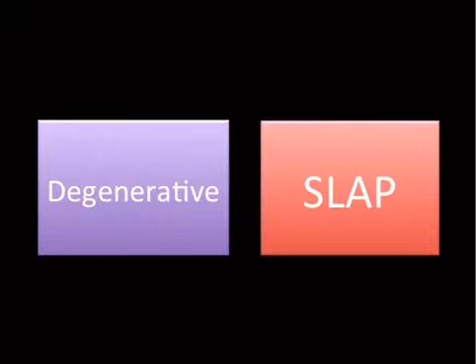The way that I think about slap tears is that you basically have degenerative tearing, and this is from being a normal person working out over the course of your life. You just crush your labrum, and it changes from a black color to a gray color as it gets chewed up. Or you can have a slap tear, and this is more of like a knife-like injury that is seen in like overhead throwers or overhead movement athletes like swimmers.